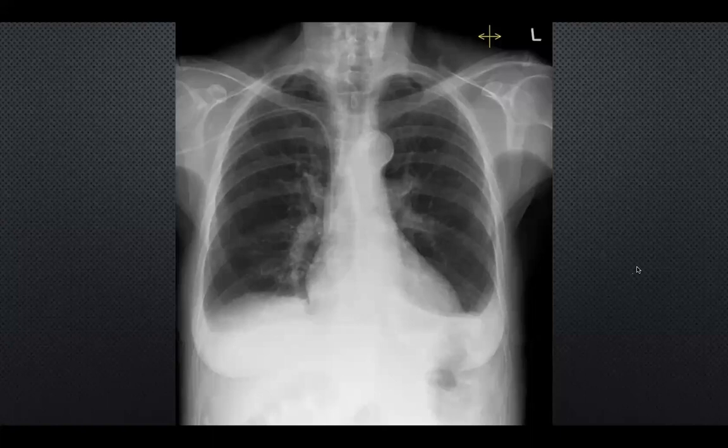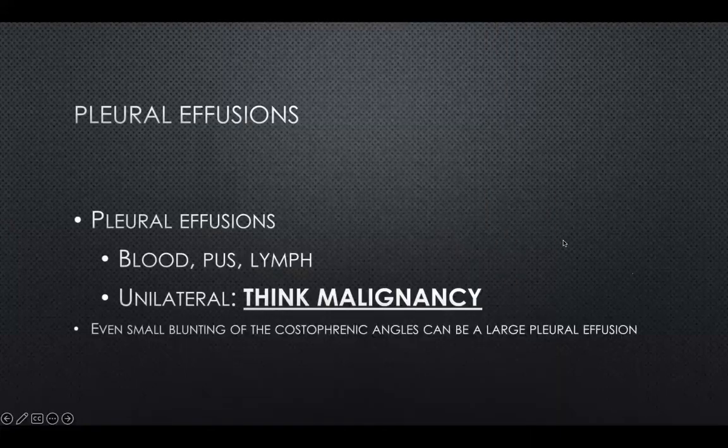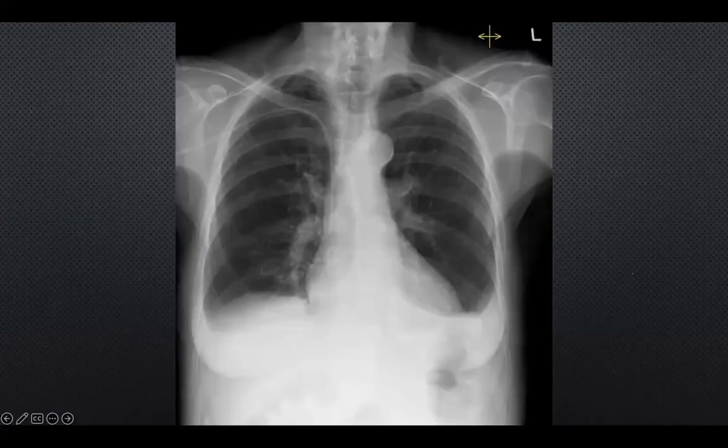Okay, that's great. So you've gone through again with your system, and that's really good. What I would say, I don't know if it might be the projection that you're getting, because this isn't a very good image, but if you look closely, you can actually see lung markings all the way to the edge, together with vascular markings as well. So I don't think there's a pneumothorax, but obviously if you're seeing it very dark, you'd want to raise that as a suspicion. But I can see lung markings all the way to the edge.